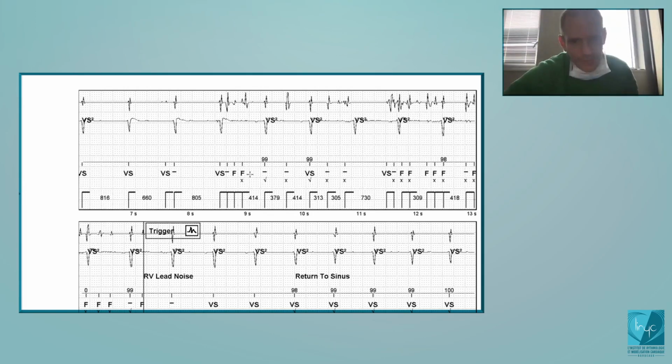So to open the noise counter, you need at least 2 out of 3 fast cycles here. Whatever, I don't give you the details, but what you see here is a false tachycardia. But now, if you have a look at the discrimination channel, you see there is no noise here, at least no oversensing. Therefore, you are fast here, but slow on the discrimination. There is a discordance between these 2 channels.